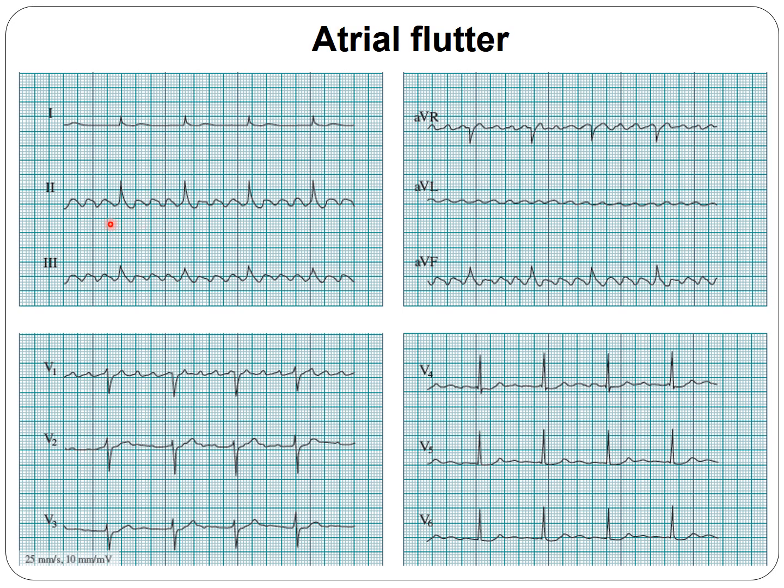Looking at the graph, you can see that the heart is regularly beating. The rate, 1, 2, 3, 4, a little bit less than 4, so it's 65, 70. We have a very fast atrial rate, that is the F wave, that ranges about 300. But not every F wave is followed by a QRS complex. This is 1, 2, 3, 4, 1, 2, 3, 4. Every fourth has a QRS complex.